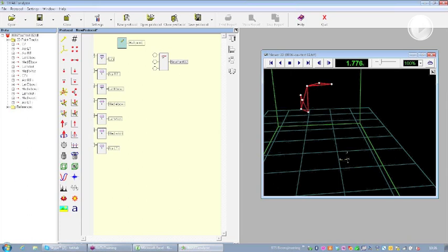When I click over OK to confirm the name of the input, of course the software asks me which is the value of this input. That is going to be half, so 0.5.